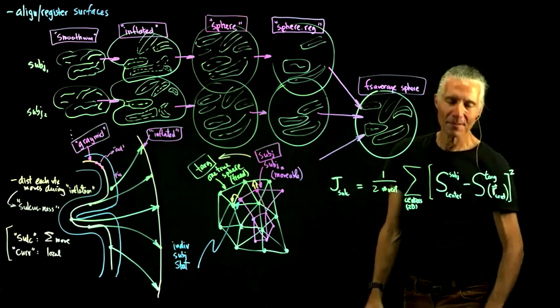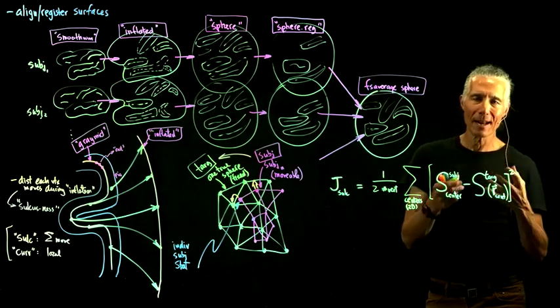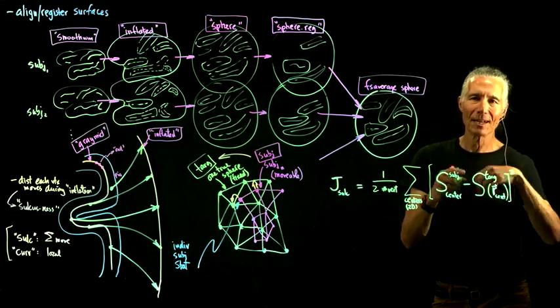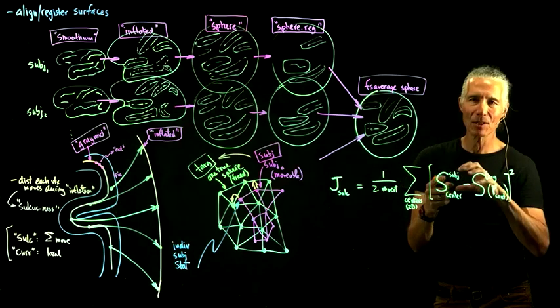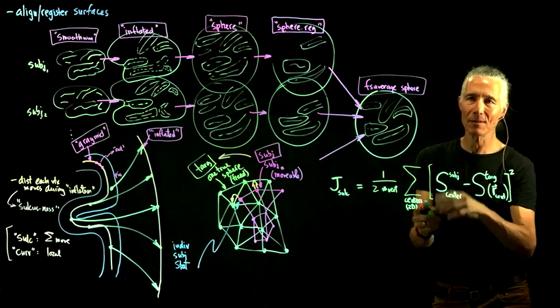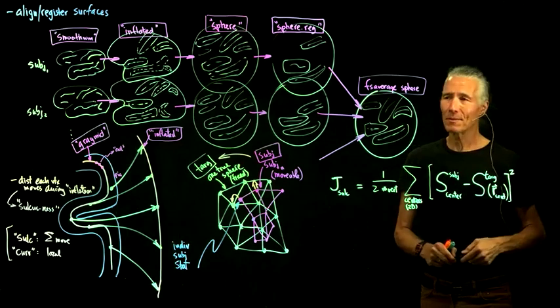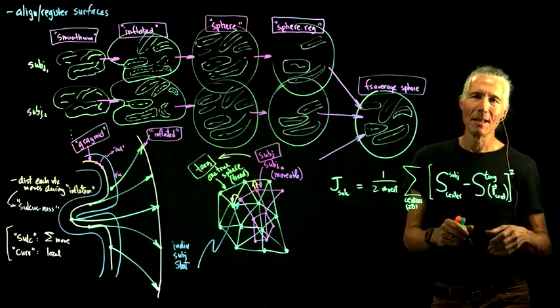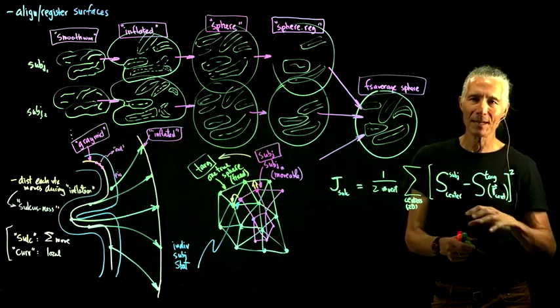And there's a little bit of play there, because you can decide how much should I try to preserve the original, how much should I stop it from squishing, and how much should I line it up in sulcousness. Those are up for discussion: what's the best possible combination of making it line up with the average brain but not squishing it too much?